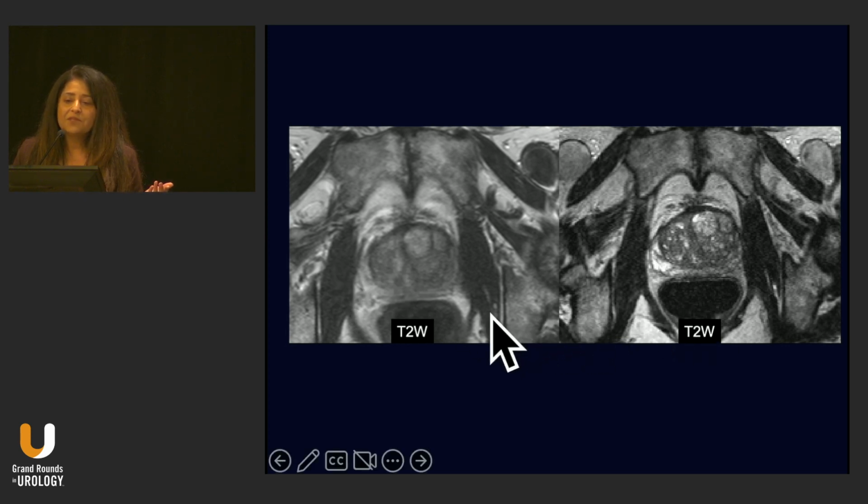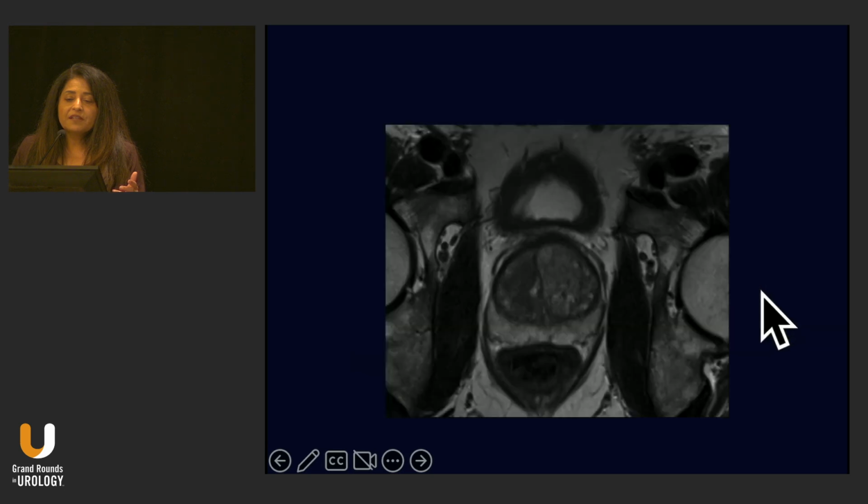These are both exams done using the PI-RADS version 2.1 guidelines. On this first one, there were two PI-RADS 5 lesions that were read, because this was measuring more than 1.5 centimeters, and you couldn't follow the margins. But if you acquired the same exam with faster T2 weighted imaging, you can follow that these are just transition zone nodules and not truly cancer. So even today, you can see the smudged margin, et cetera. That was the problem.